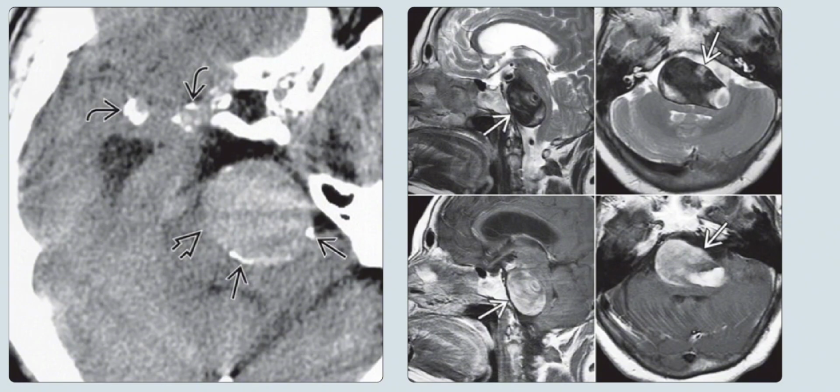Left is the non-enhanced CT scan, and it shows a typical hyperdense atherosclerotic fusiform aneurysm with mural calcifications. Also noted is the extensive calcification of the internal carotid and right middle cerebral arteries. Right is the series of MR images, which shows the bizarre appearance of a classic atherosclerotic fusiform vertebrobasilar aneurysm.